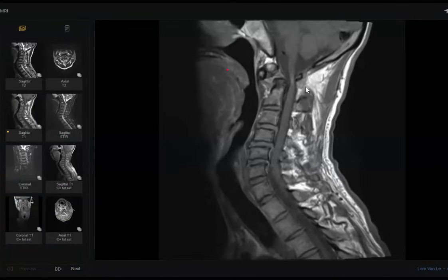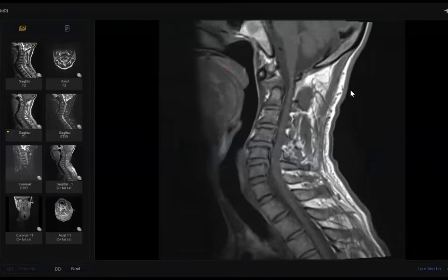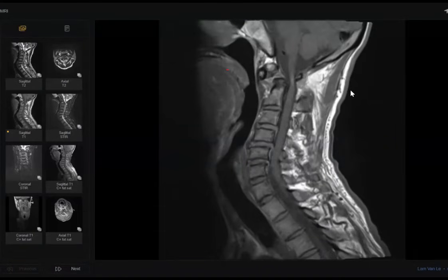Thank you, doctor, so much. It was a case of atlantoaxial subluxation. And see, this is os odontoideum that is not fused, unfused. You enumerated all possible differentials. It may be a deposition of mineral like CPPD, but it has a cortex and medulla.